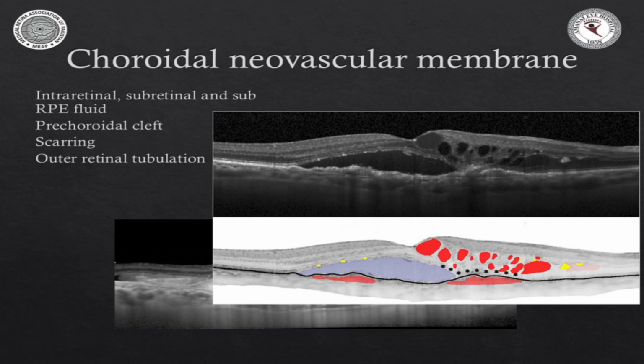All right, so as I began my talk, I was talking to you about how you see so many OCTs and then one day you start to pick up patterns which have not been described previously. This to me was my case number 1, and at that time this was in 2016. I shared this with one of my mentors abroad, at an OCT reading center, and he said I've never seen anything like this. And then after 3 weeks, the same thing came to me again.